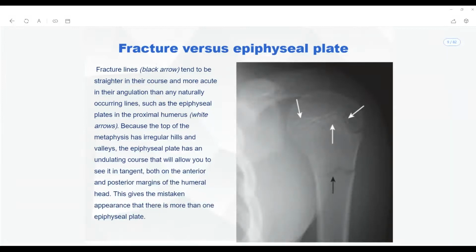This one will help you to recognize if the fractures have happened in the epiphysis, metaphysis, and the diaphysis as well. Using this kind of classification and observation method, you can recognize if the fractures have happened in the epiphysis or in the metaphysis and other places. That we will learn, but here what I'm looking at is the epiphyseal line and this is the fracture. Okay, right?